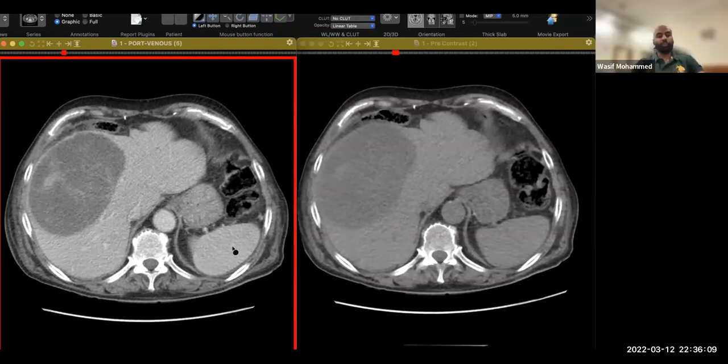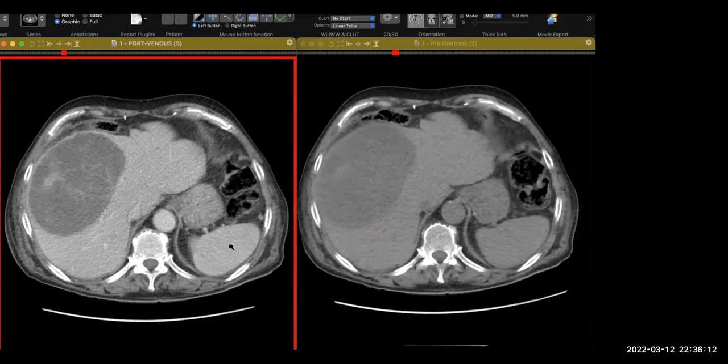If you had to pick one, which would it be? I will pick abscess rather than hydatid, and because it's solitary, I will pick amoebic abscess as the first differential in this. So if it's an abscess, even an ultrasound can help to further see the internal contents. Next case.